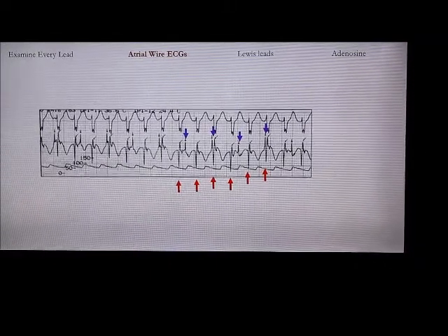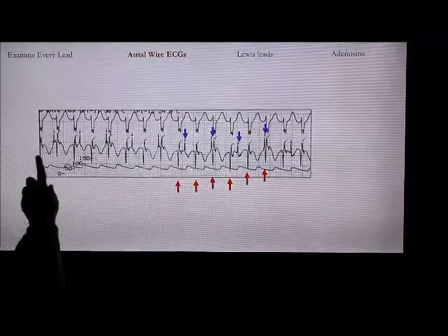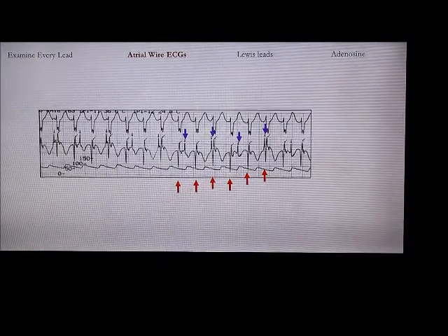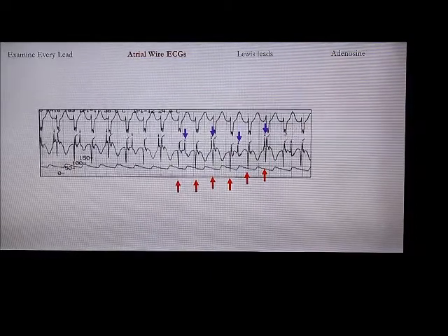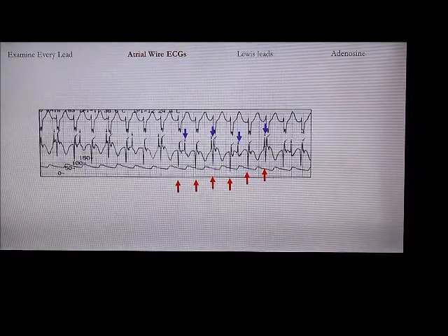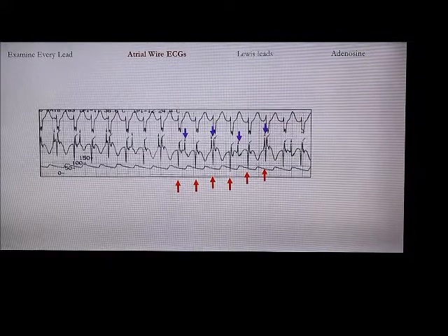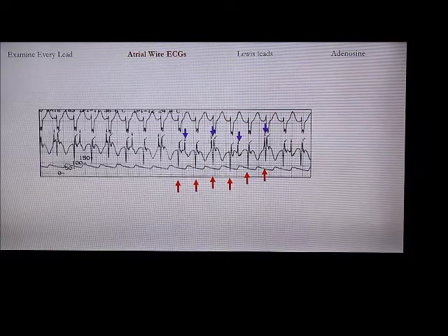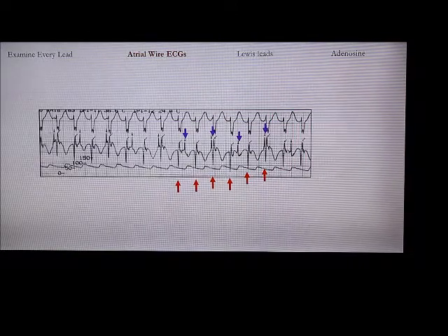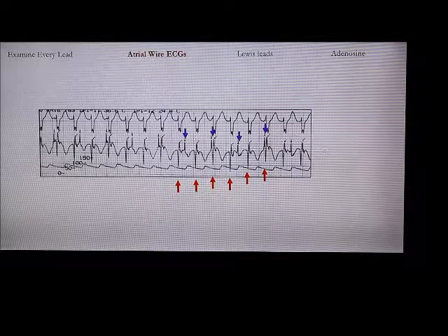Okay, this is another patient who has the rhythm in the top. Okay, so this is the baseline surface ECG. He has a bundle branch block, which is similar to his baseline, so we'll call it a narrow complex tachycardia, and we apply all the protocols of narrow complex tachycardia. So the first thing we want to see is where the P waves are. They are not clear in the ECG, so we'll do a wire ECG, which is the strip underneath. Okay, so here underneath I have this kind of morphology, and I have this and this.